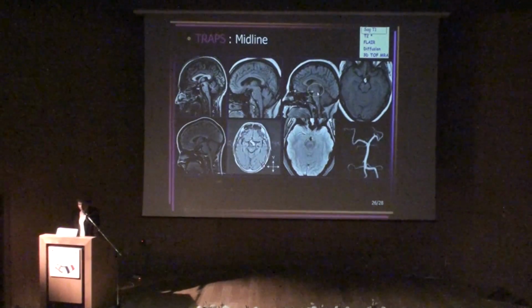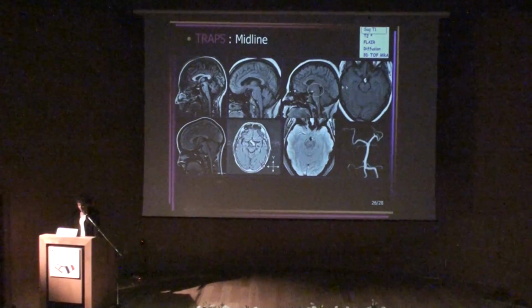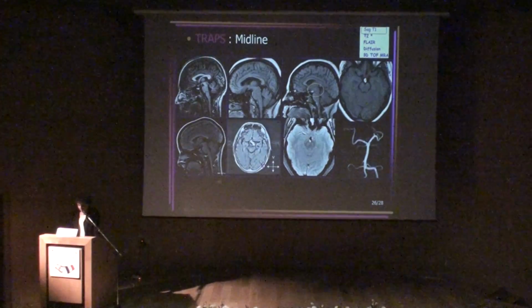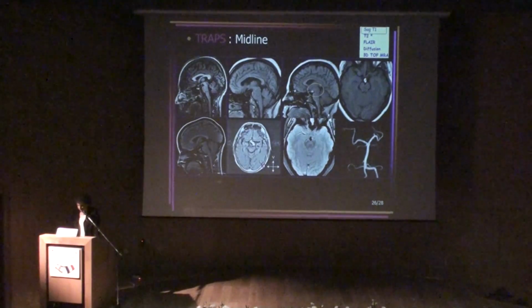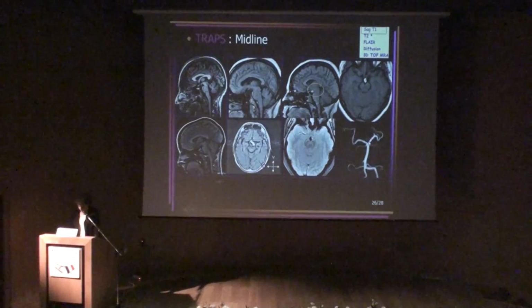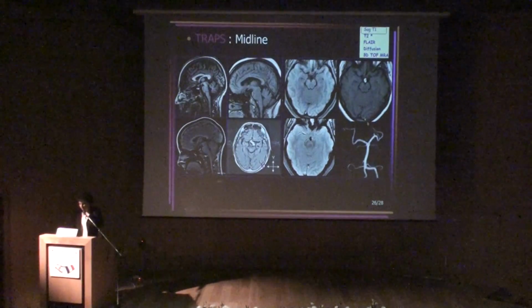And other things you can find on the midline is this type of lesion. Here it's bright on T1, it's bright on T1 again. It's dark on T2 star-weighted sequence with the sequence we use. It's located at the top of the basilar artery, but on the MR angiography there's not much here. So I let you think for 1 second. So, of course, it's a lipoma.